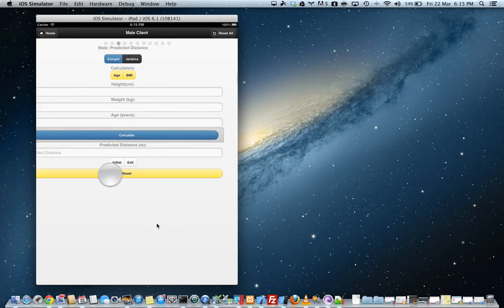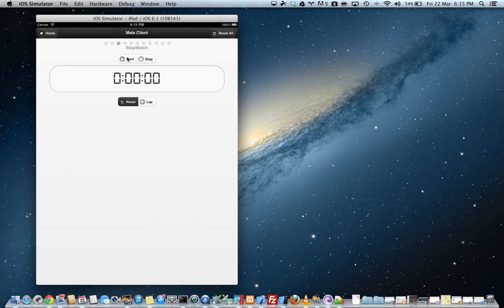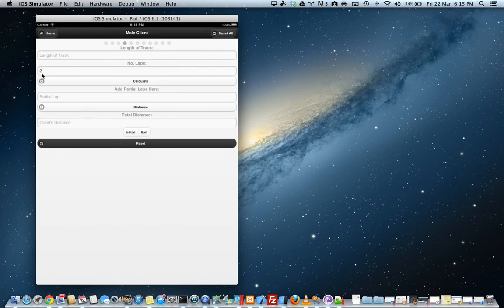Alright, moving on. The stopwatch works as always. I'm going to add the sound in later and vibrations in later on your device. So on your device it should beep and it should vibrate as well. And also got your lap counter here. Okay. So I've added 2 laps there, that's fine.